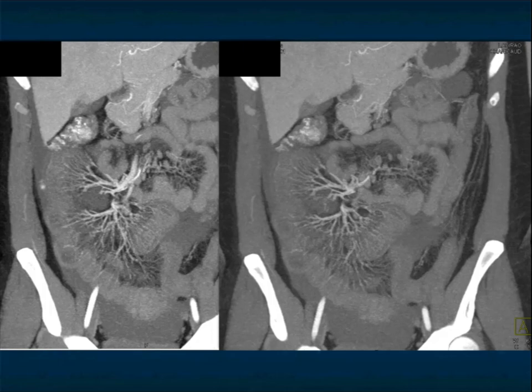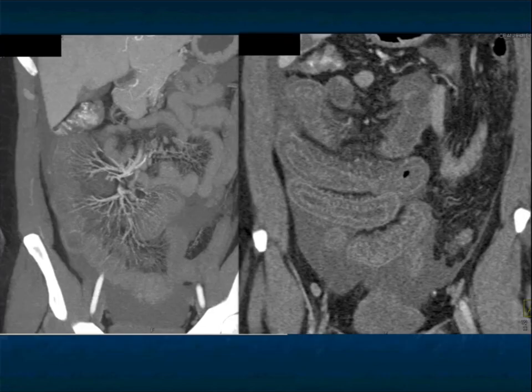There was no occlusion. And the key finding is the patients were just recently put on hypertensive medication with ACE inhibitors. Now, the reason this is often a challenge, besides it's a difficult case, is the patients come to the ER with an acute abdomen. So now you're evaluating an acute abdomen, and perhaps you don't think about these possibilities.